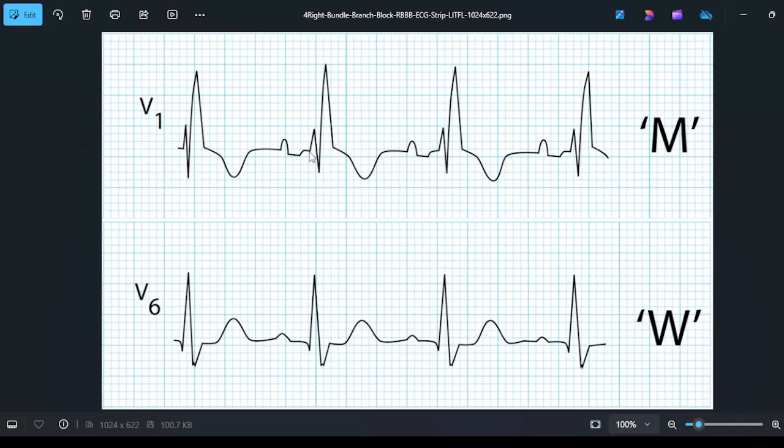See, here you are finding a positive wave and then a positive wave, and this looks like an M, right? It's a typical M. You will find this. So that means there is a positive R wave in V1, V2, V3, and see again there is a wide QRS complex. Your Q starts from here and your S is ending here, so it is near about 4 squares, again 4 or 3 squares. So this is again a wide QRS complex, but there is a positive deflection in V1.